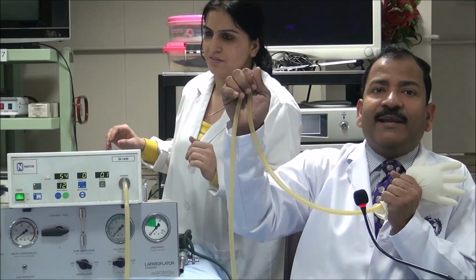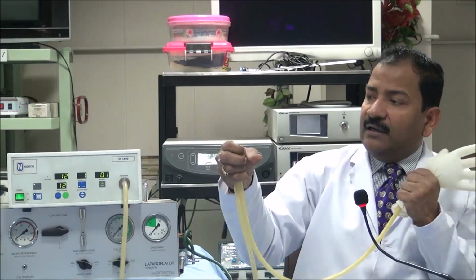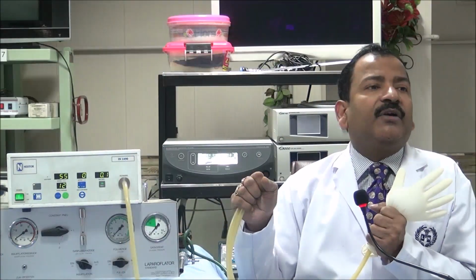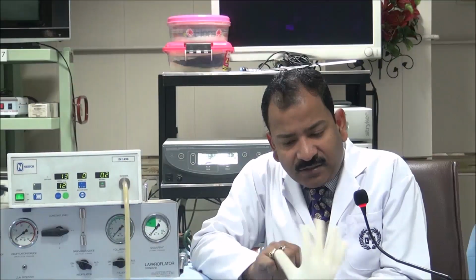But as soon as I leave it, the alarm will go. Again I will give some blockage somewhere. Now this is the blockage. After 3 seconds, it will give you alarm, and the actual pressure is high. Can you see that? Yes. Why is it happening? Tell me, right now also gas is not flowing.